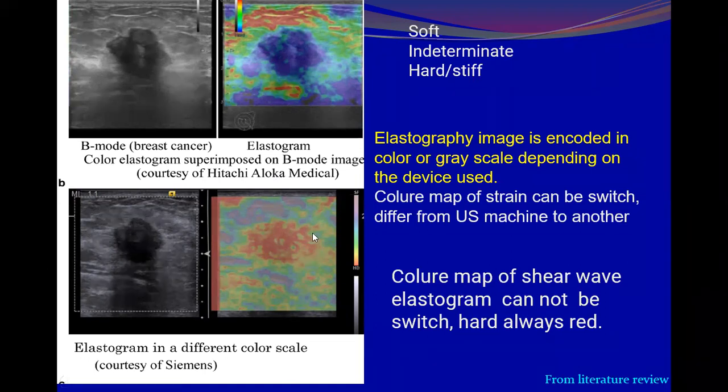What is the difference between the two? In this case, they use the blue color. Reversal of the color map: they switch the map.